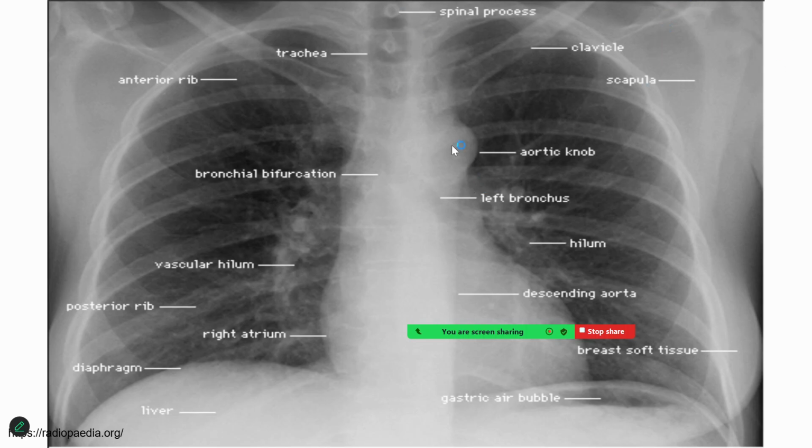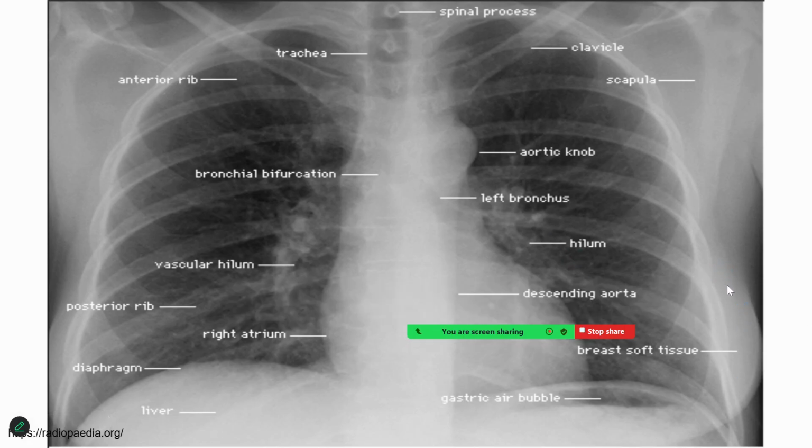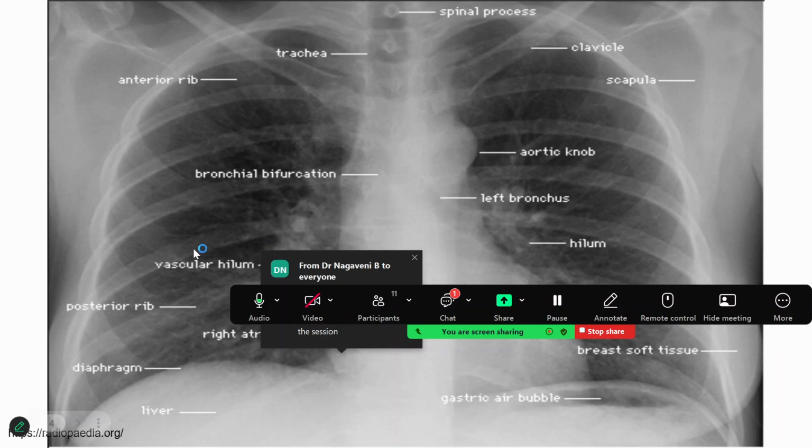the midline. You will have the vertebral column, which will give you the mid-axis; the spinous processes and vertebral bodies are seen in the middle. The ribs would form the hard cage of the thoracic cage, and then the soft tissues around would be covering the area, which also will produce a soft tissue shadow. And the structures of the lung tissue are visible through the soft tissues of the body, and also seen through the rib cages, the space between the ribs as such.